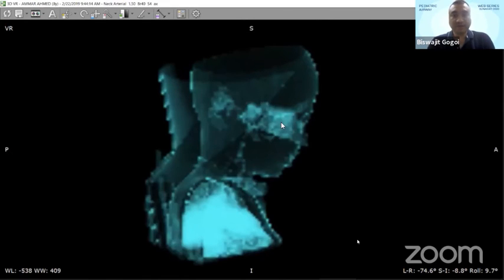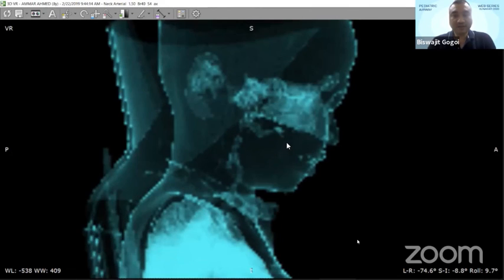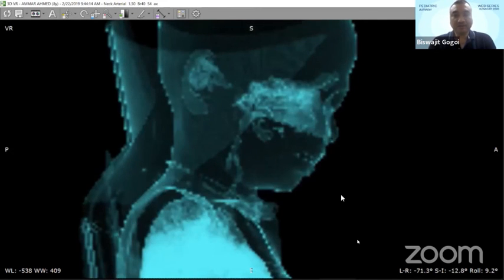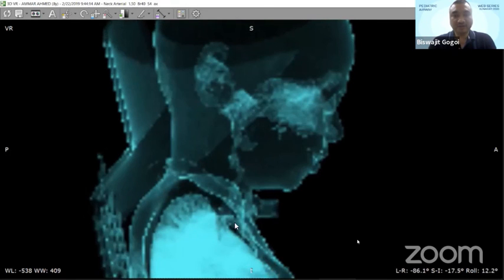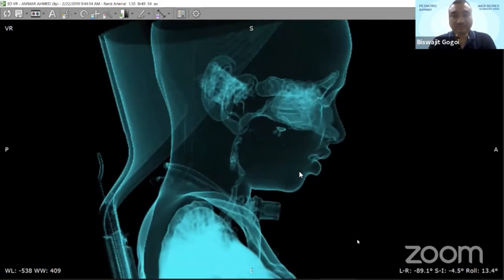If you see the airway of this child, then we can appreciate his airway, and you can turn it a little bit. This is the child that yesterday Keshav showed in a video during his talk on tracheal stenosis. So you can appreciate this is a tracheostomy.